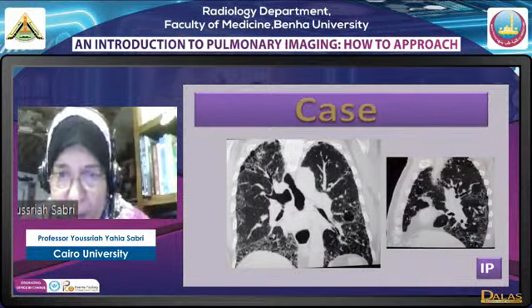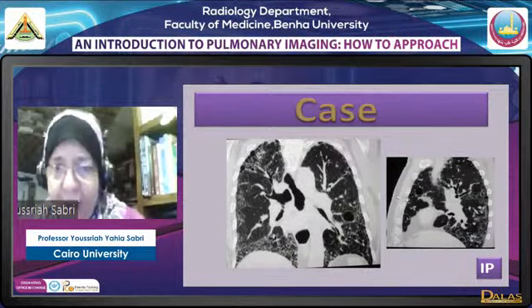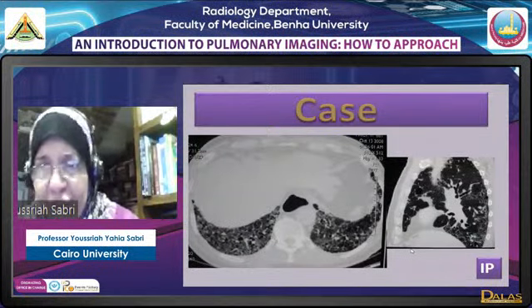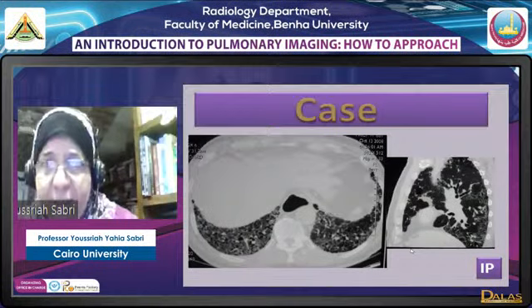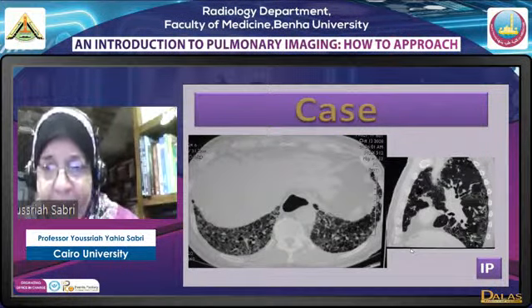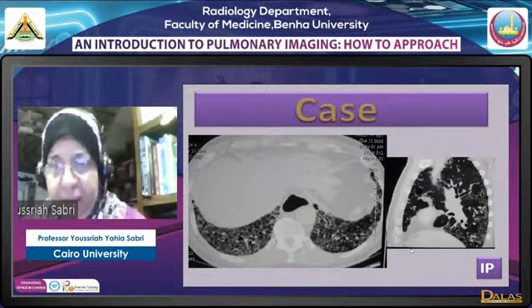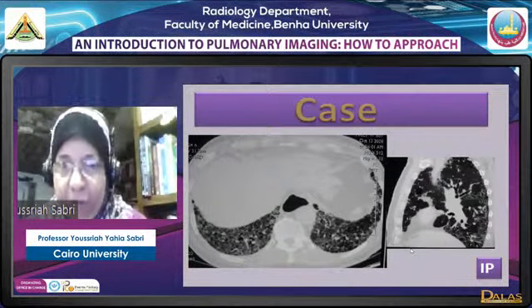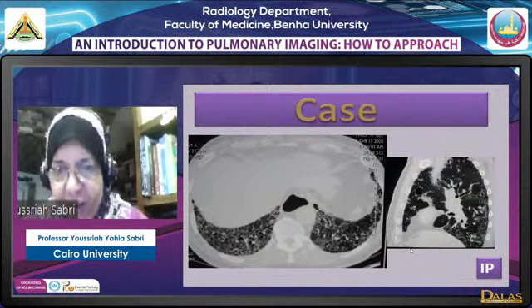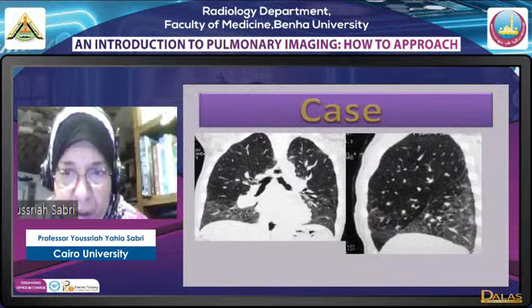In this case also, as you can see here, there is a cyst seen on the left side in the coronal image and anteriorly in the sagittal image. These cysts, in addition to the interstitial pattern of this disease, will suggest that interstitial fibrosis here is a type we call lymphocytic interstitial pneumonia. Why? This is a pattern of interstitial disease fibrosis, bilateral fairly symmetrical subpleural, ground glass opacification, reticulation, prominent intralobular interstitium. In addition, the patient is known to be a case of collagen disease, which is scleroderma. This case is then lymphocytic interstitial pneumonia.